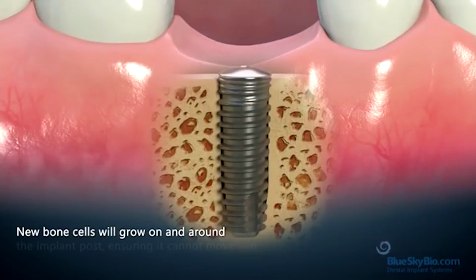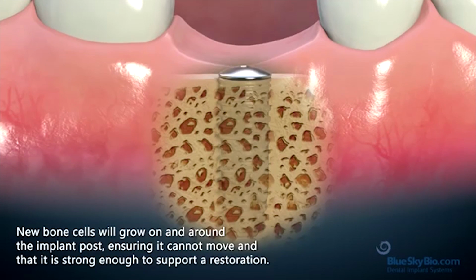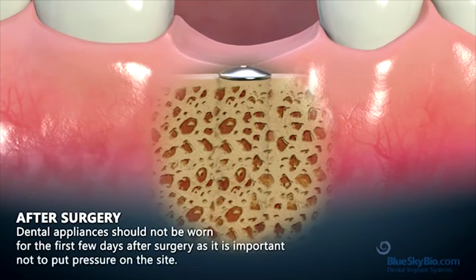During this process, new bone cells will grow on and around the implant post, ensuring it cannot move and that it is strong enough to support a restoration. To assist healing, dental appliances should not be worn for the first few days after surgery, as it is important not to put pressure on the site.